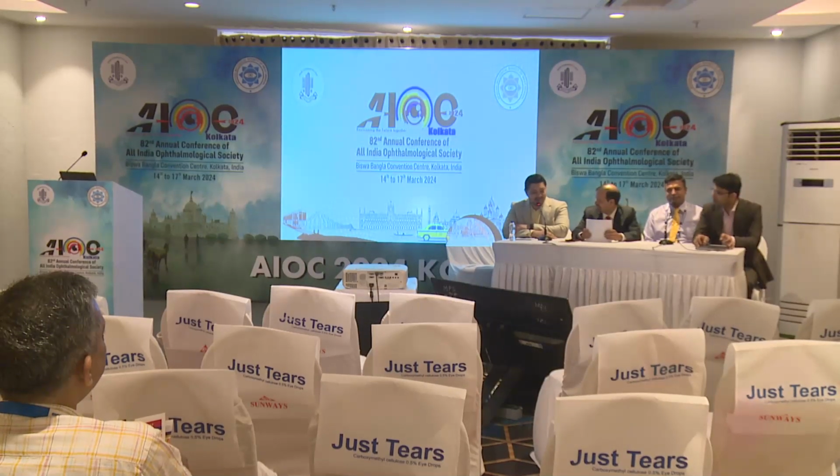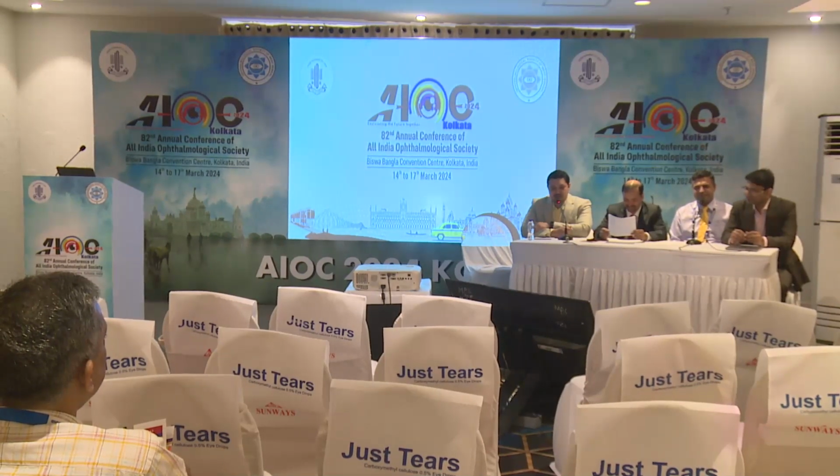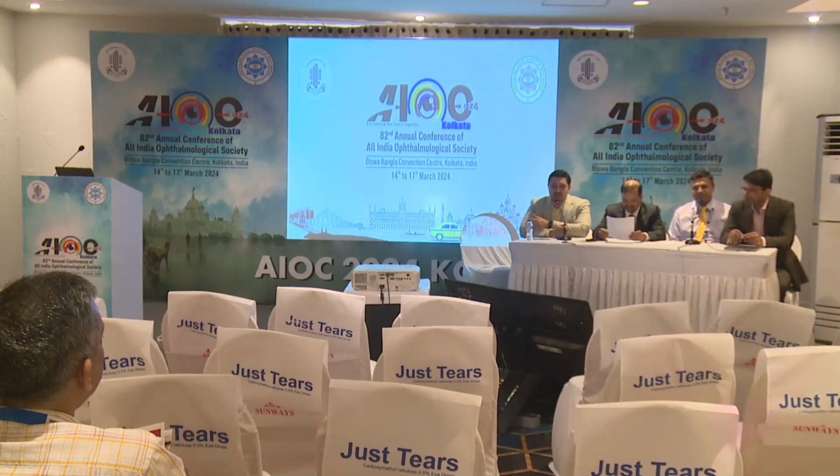This Sunday morning, today we are going to discuss a very important investigative modality, or even I can say an indispensable VR diagnostic tool, that is OCT angiography. OCT angiography is a non-invasive tool and has now been there for a decade. The non-invasiveness of this tool makes it a very desirable tool for any VR surgeon. So we are going to start today with a brief introduction about the utility of OCT angiography and how this can be used in research.